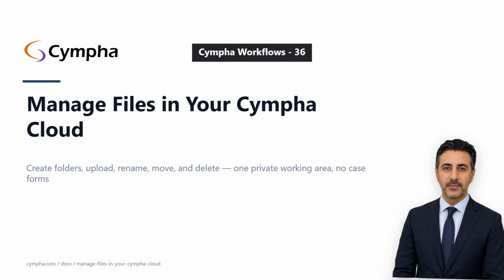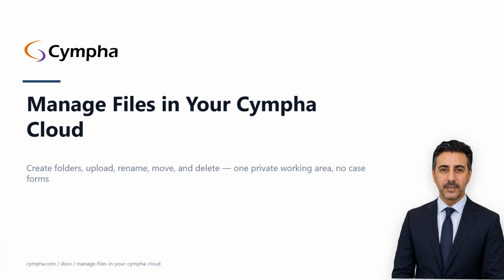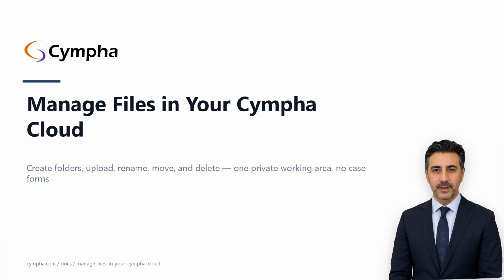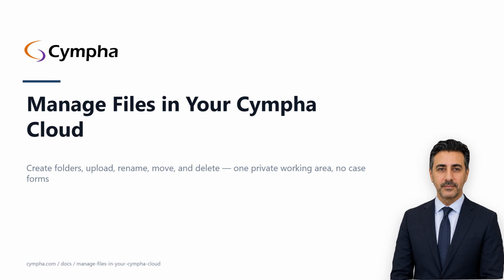Every Cympha account comes with a private file area called My Cloud, a place to collect scans, photos, and project files before they belong to any case. This lecture is for anyone on Cympha: clinicians, lab managers, designers, intakers. By the end you'll know how to open your cloud, what each of its 3 sections shows, and how to create folders, upload files, rename, move, and delete without ever touching a case form.